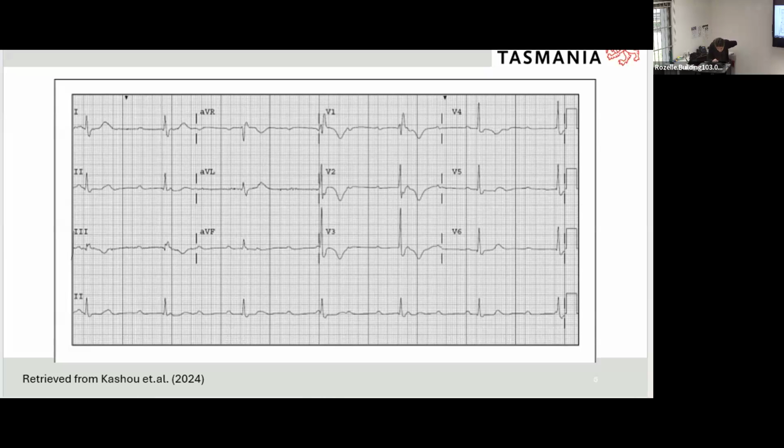So for example, the shape of this one compared to this one, they're all different sorts of shapes. So potentially, to your point, we're not seeing the P wave properly because it's being hidden in that way. Is that, yeah? John?